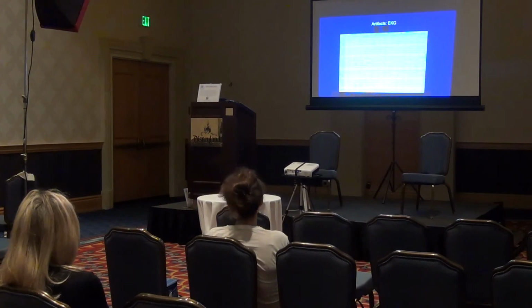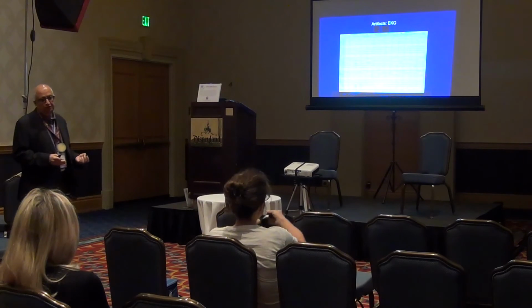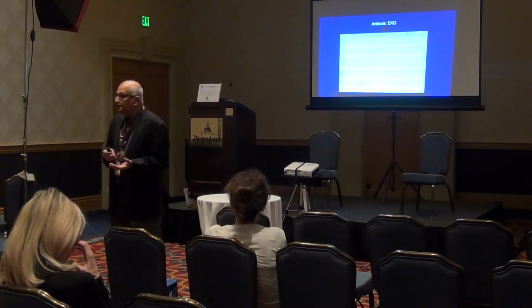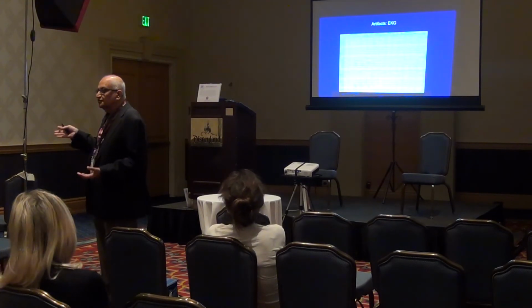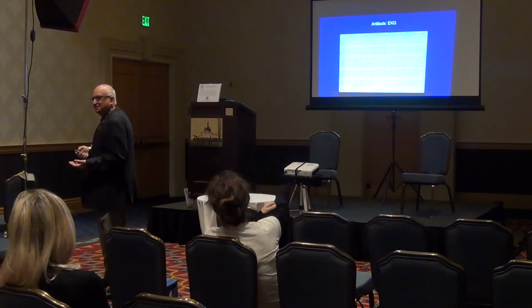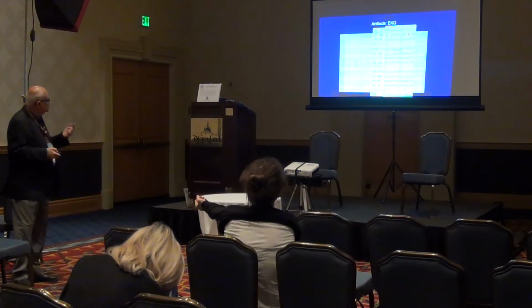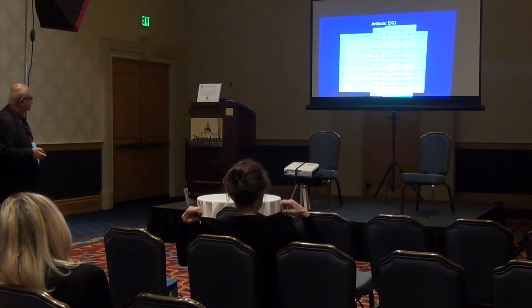It's very, very important to know how many artifacts you can get. Particularly if you're in the NICU or ICU, there is so much electrical stuff going on there, right? People used to say you can stick a couple of electrodes in a bowl of jello and record beautiful waves. It's just not brain activity, right? So here is just a magnification of the EKG and the T3-A1 lead showing the EKG.